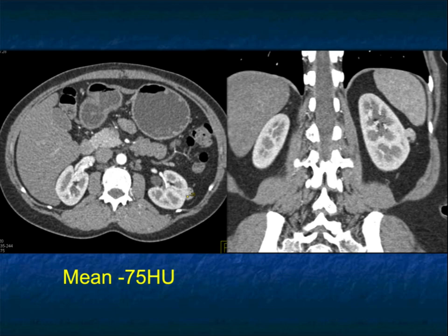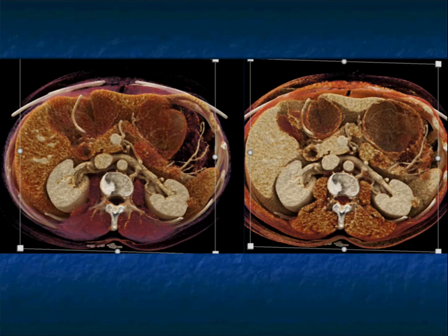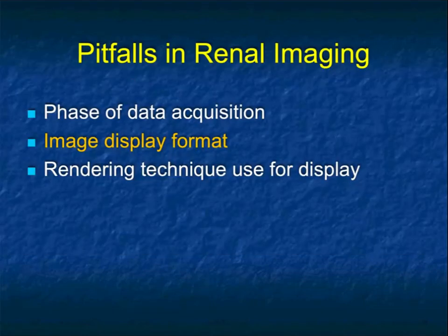The angiomyolipomas have varying degrees of vascularity. They have varying degrees of fat. Sometimes it's all fat. They're easy to diagnose. The lipid-poor ones are harder to diagnose. They tend not to bleed, but they can simulate renal cell carcinoma. Here's that same case using cinematic rendering.